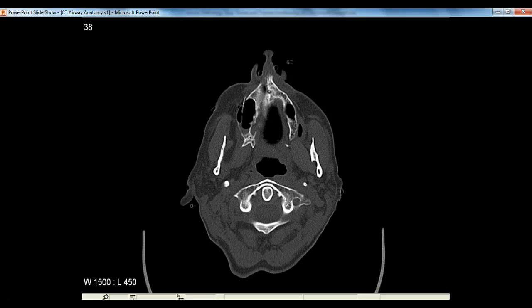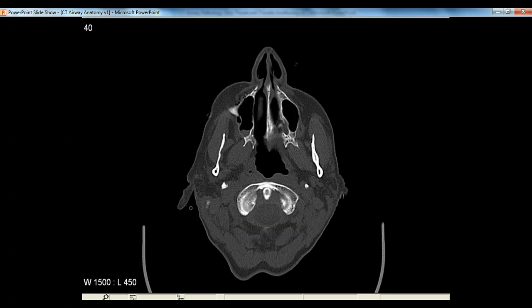And during pregnancy, when you're developing as a fetus, originally that's an open space, and then the palate closes through there. So people with a cleft palate, that's partially open, and that can be open all the way out to the lip at its most extreme. So you see those structures basically separating the nasopharynx from the oropharynx, and you can see it's a flat structure.